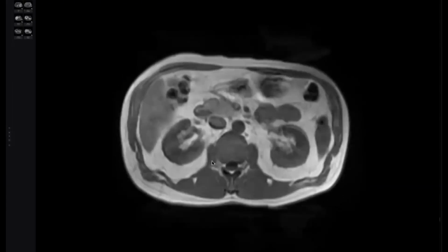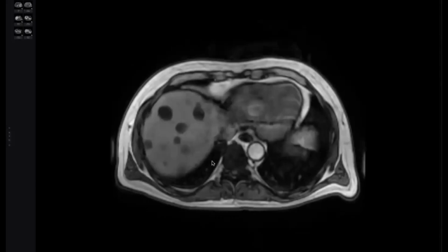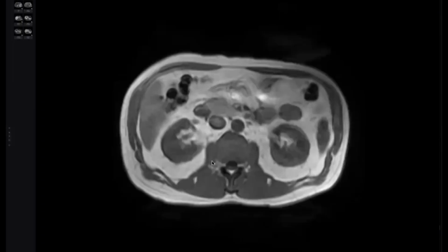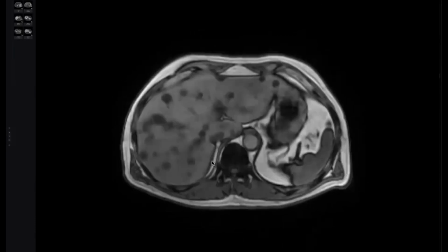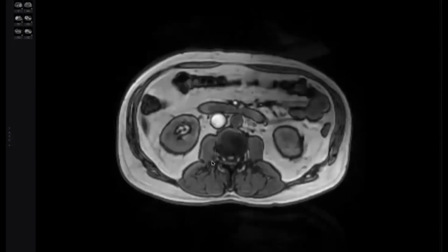Okay. So, my colleagues, take care with in and out of phase MRI in the abdomen. Number one, about the angiomyolipoma. Number two, about the suprarenal, either adenoma or metastasis. Okay, number three, this case, focal fatty infiltration. Number four, in the pelvis, about the dermoid cyst.